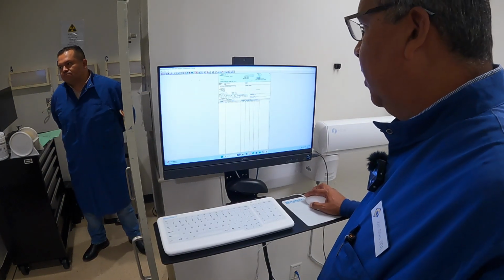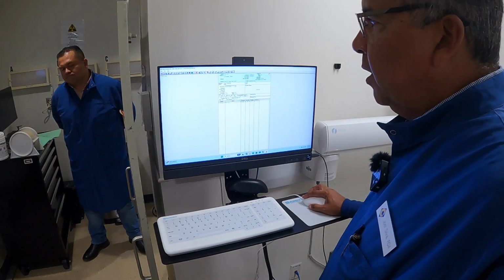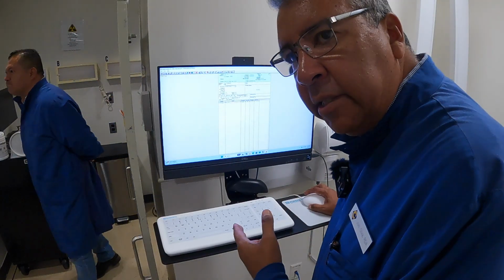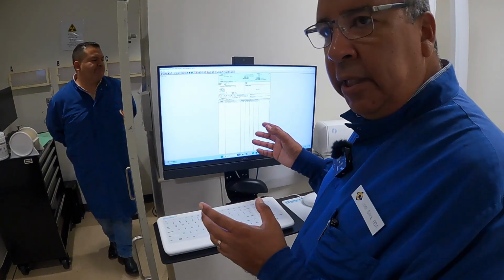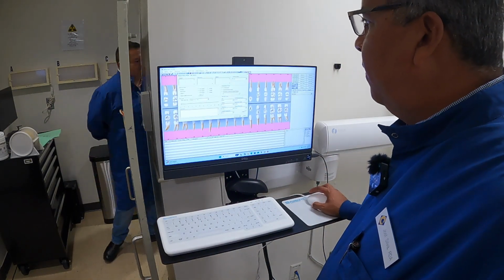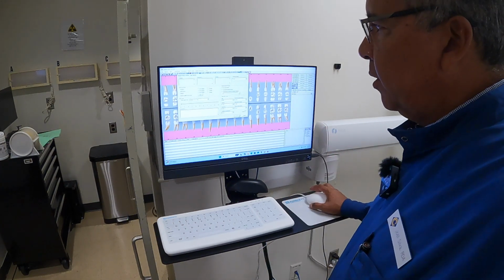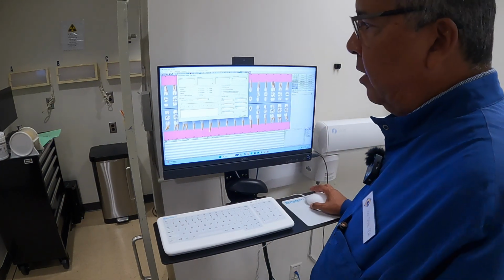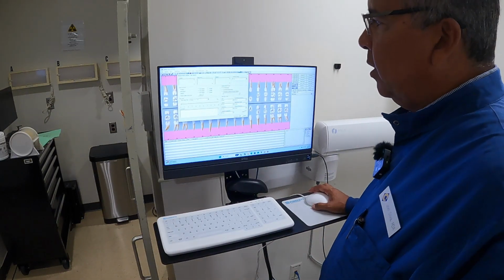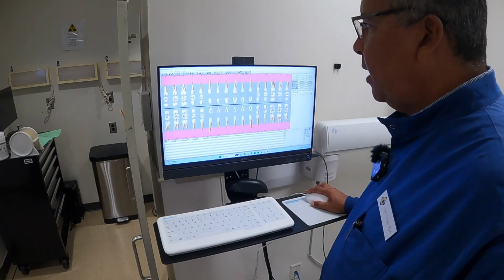So now that we have verified, we're going to click on this tooth, and it says patient chart. Okay, so this is now accessing the window that we need to actually take x-rays. So we're going to click on the patient's chart. And then this menu will always pop up. On a real patient, it comes up in dental hygiene with their patients all the time. Every time a patient comes in, we want to know, did their health history change in any one way or another since the last time they were there? We don't need that for our purposes, so we're going to go ahead and just X that out.